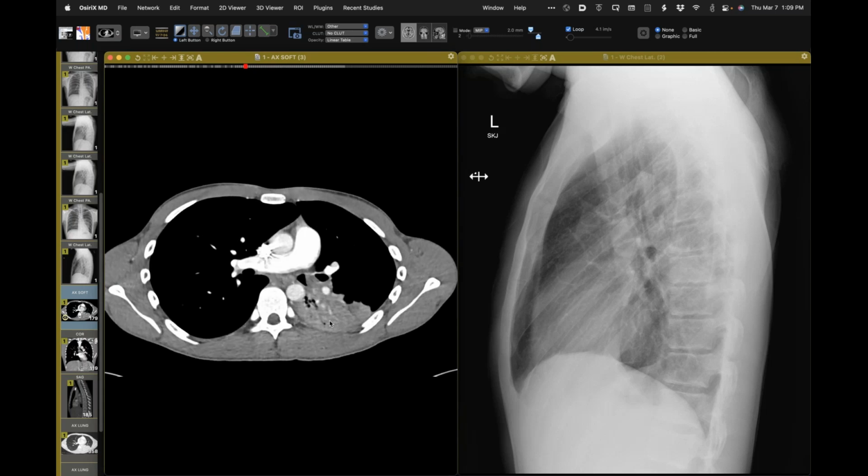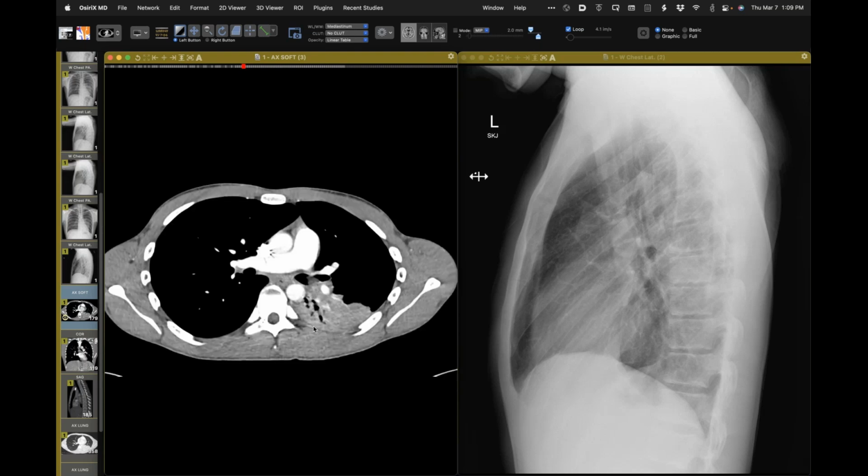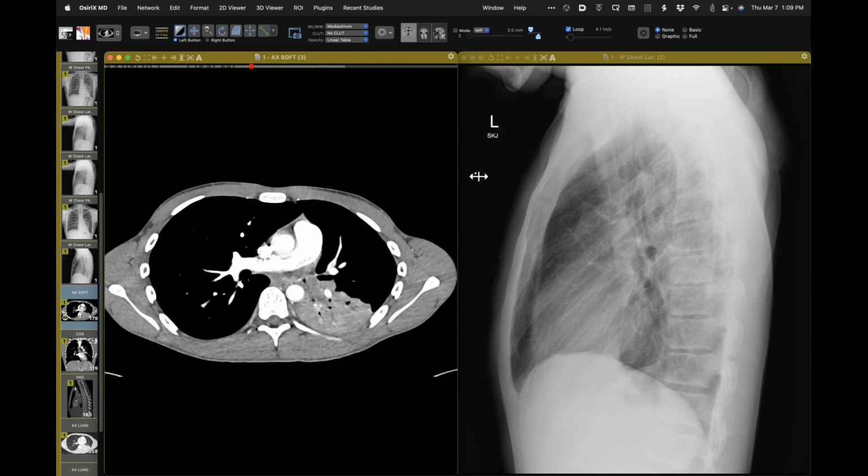And then here we can see that there is an endoluminal abnormality right here. Given the fact of left lower lobe collapse, one can reasonably intuit that this is the top of an obstructing lesion that is located here that protrudes into the distal left main bronchus.